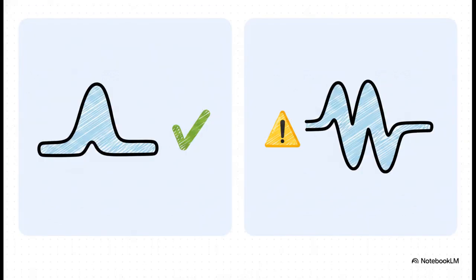Let's move on to our second suspect, breath stacking. You might also hear this called double triggering. A completely normal breath shows a single, distinct peak on both the flow and the volume curves. But with breath stacking, you'll see a normal breath and then instantly 2 quick breaths in immediate succession, stacked right on top of each other. The patient is literally double triggering the machine.